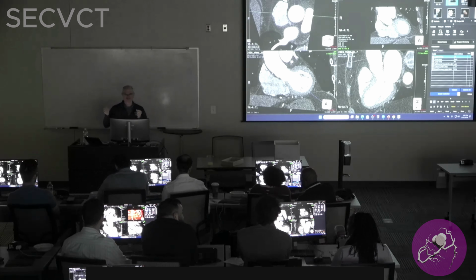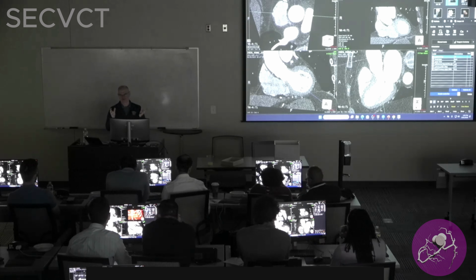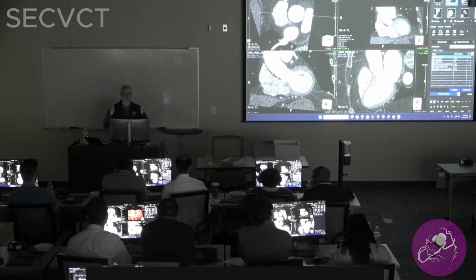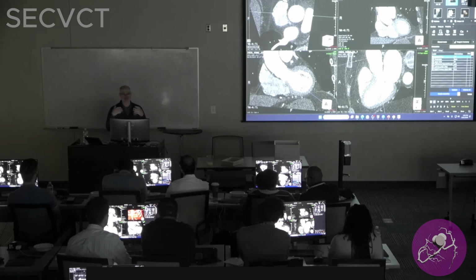If you measure the perimeter and you measure the area, those should be pretty close together. I like to have them about a millimeter or less off, but I look at those as a quality measure and try to understand why those are off.